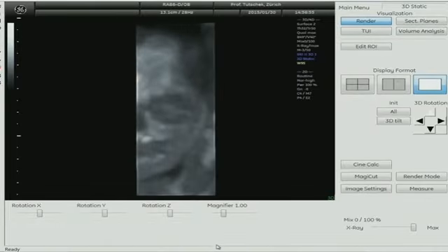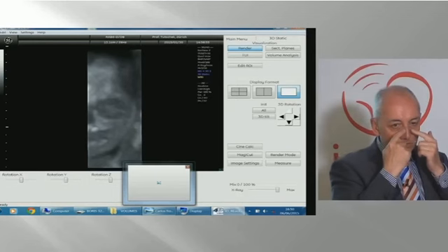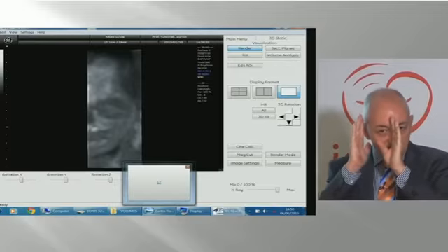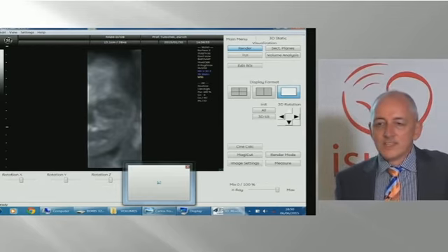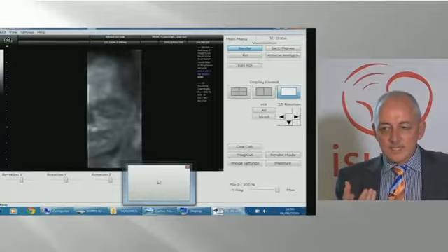I do this half face reconstruction because if you look from the side, you can see the nasal bone better. But if you look from the side and you have two halves of the face in one box, you will have superposition of the two bones. So look at this half first and then at this half. Then you can know if there's a nasal bone on either side, how big they are. Not that I think that it's absolutely important to know the nasal bones, but it shows you how to tease out bony structures a little bit better.